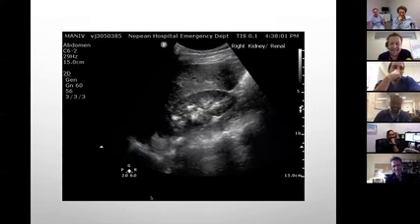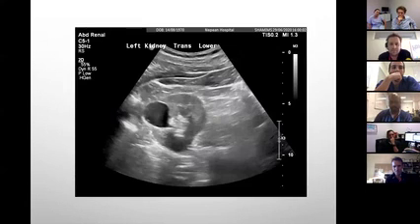All right, last one. Multiple echogenic foci within the kidney. Nephrocalcinosis. Anything else possible? Could it be gas within the kidney? Thank you very much. It could be gas, it could be a calcification, it could be stones. A few possibilities again. You need to think about those possible differentials. You can't settle it with one thing. What type of cyst is it? Simple. Bosniak 1. Okay, thanks.